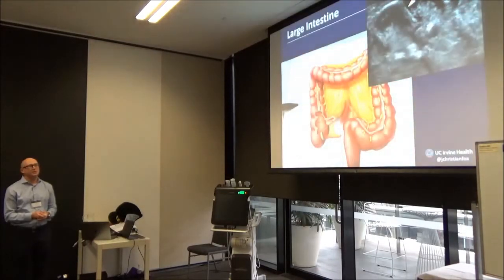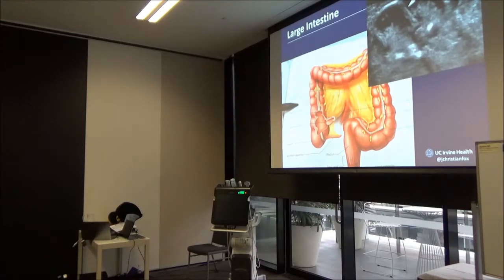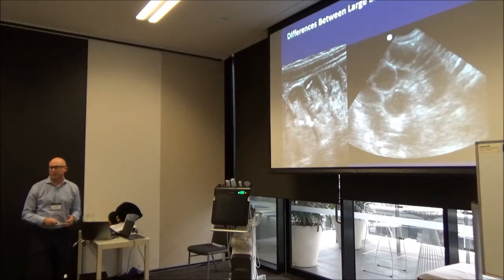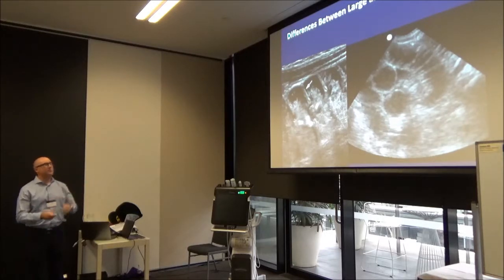And again, normally you don't see them unless there's some kind of colonic obstruction where there's fluid displacing some of the air. And that's really why ultrasound is so good for small bowel obstructions, because when you have pathology here, you have fluid replace the air, and then boom, everything just lights up like a Christmas tree. It's beautiful. So these are 2 examples here. In both of these situations, there was an obstruction. On the left, there was a colonic obstruction. On the right was a small bowel obstruction. And I just wanted to point these 2 things out to you, large and small intestine.